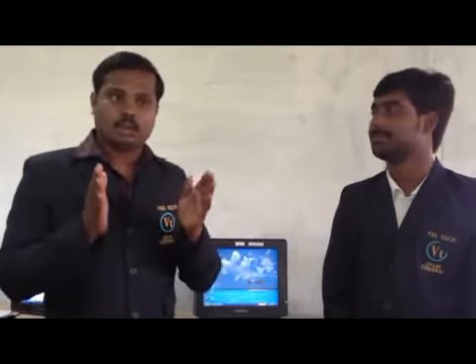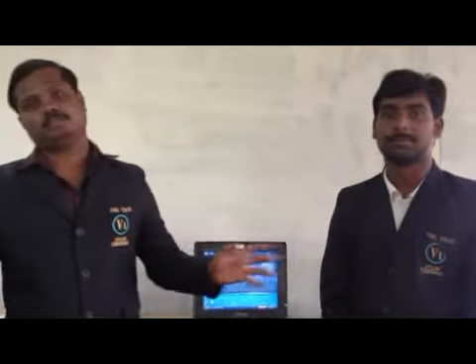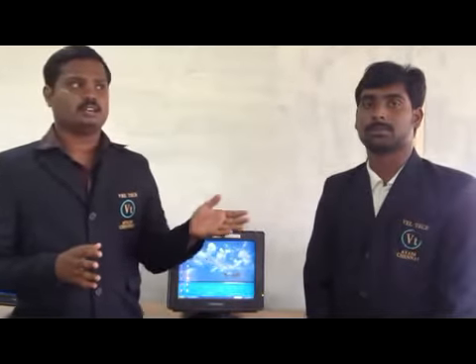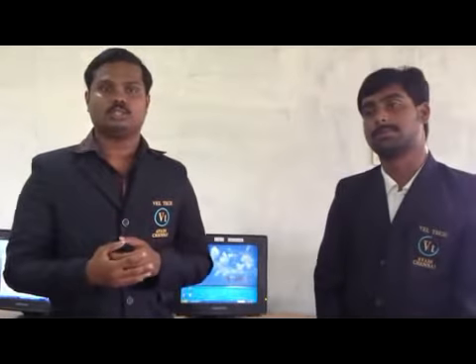Now let us see how the ophthalmologists are currently detecting these exudates, the primary symptoms of diabetic retinopathy. Now we're going to talk about the current methods of detection of diabetic retinopathy. Last week we visited Vasan Eye Care and Agarwal Eye Hospital, where we were able to see the manual detection of these exudates.